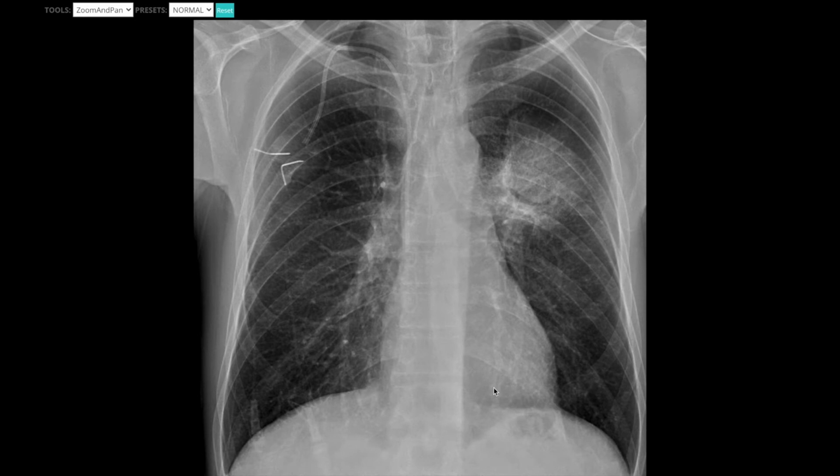So really what you're looking for is that it should be see-through. You should be able to see the vessels behind the cardiac space. Here you can clearly see the vessels, but oftentimes it becomes completely opacified, very commonly due to atelectasis, though there are many other causes that appear similarly. The same thing can happen on the right heart, and another thing to look for is pneumomediastinum.